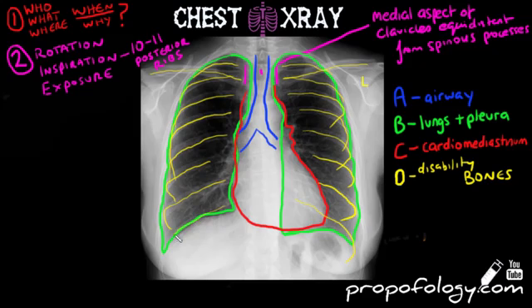You're going to start at the posterior aspect of the ribs, which is shown now. And you're going to work your way forward with each of them, looking for fractures in all of these bones or any displacement. Any fracture or displacement could imply damage to underlying structures.